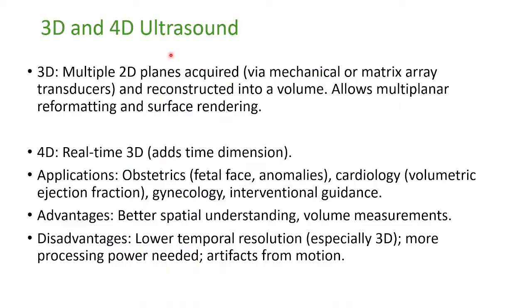We also have the 3D and 4D ultrasound. So 3D: multiple 2D planes acquired via mechanical or matrix array transducers and reconstructed into a volume, allows multiplanar reformatting and surface rendering. 4D is real-time 3D, with time as the added dimension.